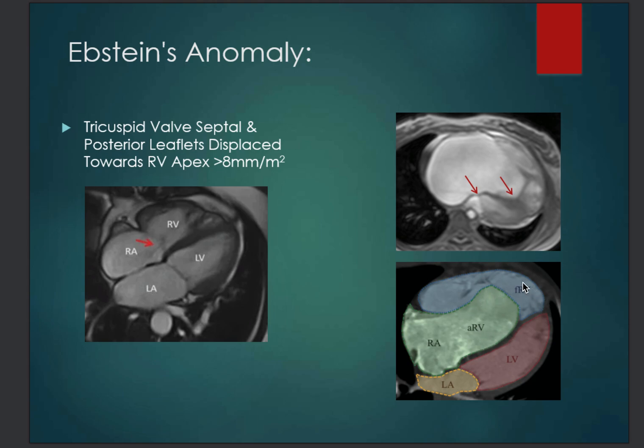The true functional ventricle usually lies anterior, and in most of the cases is dilated, and most of the function is related to the RVOT. So it's important to measure the functional right ventricle systolic function from MRI, as well as the size of the RVOT, whether it's dilated or not, because it is the RVOT doing most of the effort for the functional right ventricle. There have been in the literature some indices to measure from cardiac MRI. They are routinely measured from echo, but in MRI we could measure the same indices.